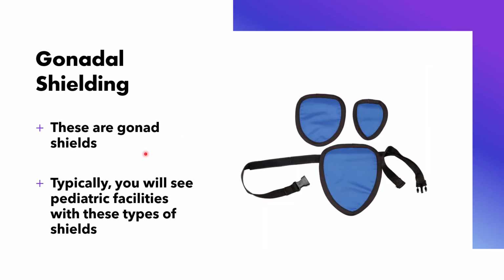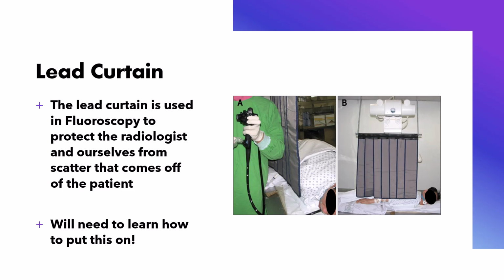These are gonadal shields that we might use to shield gonads. We don't use these very much anymore because it's hard to know exactly where the gonads are, so these are becoming less and less used.